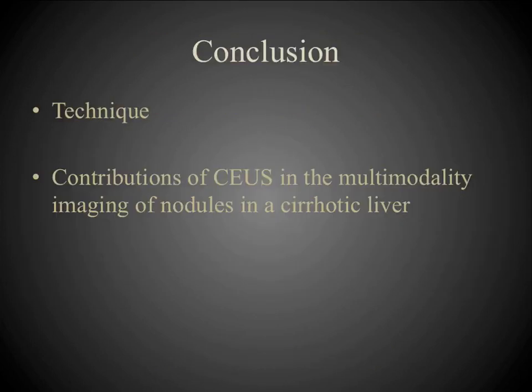In this How I Do It presentation, we have attempted to show the technique and spectrum of contributions of CEUS in the multimodality imaging of nodules in a cirrhotic liver.